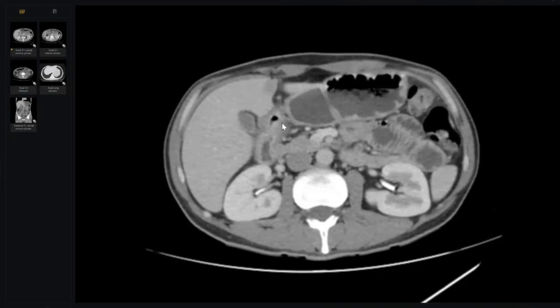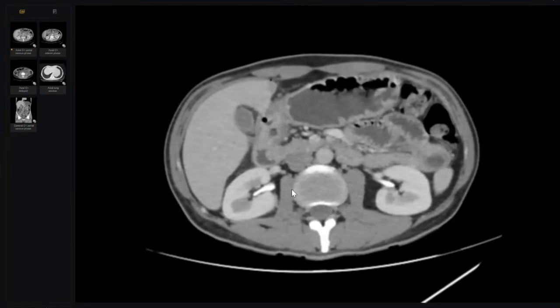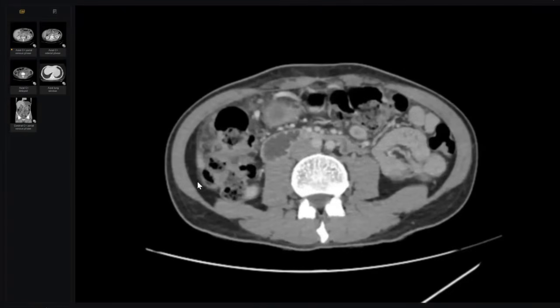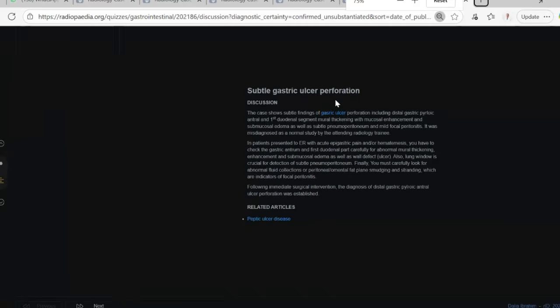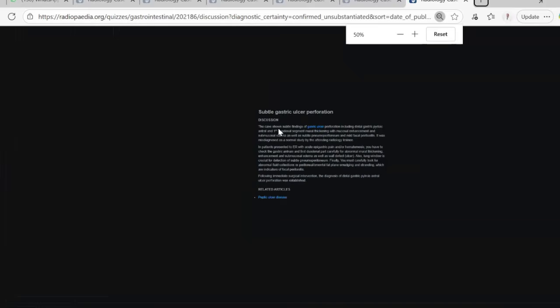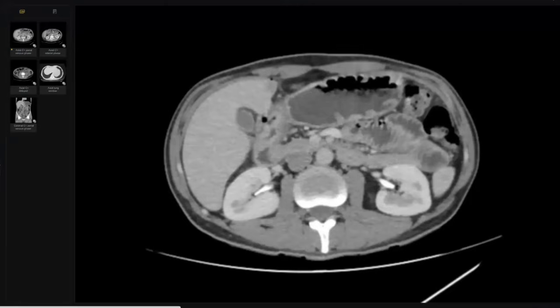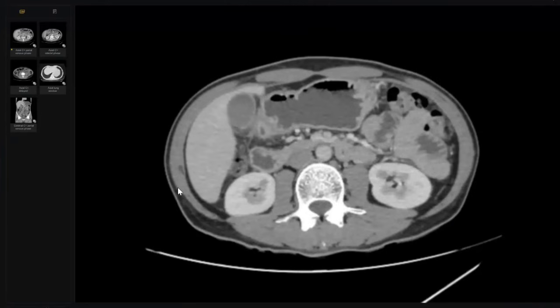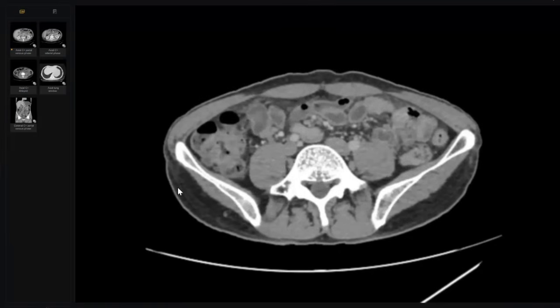How could we detect the site? The site of maximum edema and surrounding air foci. So it was a perforated gastric ulcer, very important, one of the emergency cases. I have seen many perforated gastric ulcers where after about 4 hours or more the pain started to localize in the right iliac fossa.